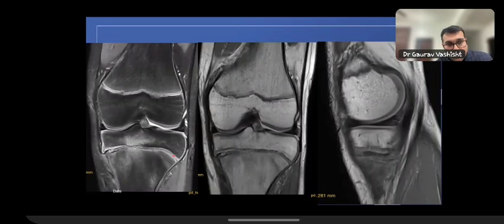The clear outline of the growth plate on the lateral aspect. But as we are coming here medially, we see that there is irregularity along the growth plate and there is widening. So there is separation which is happening here. Separation means the first stage in a pediatric trauma, a Salter-Harris injury, where we see separation of the growth plate.